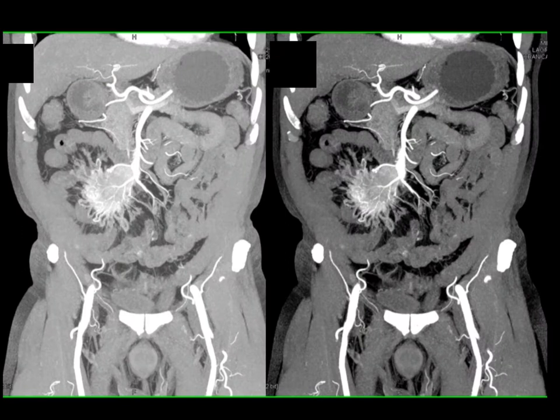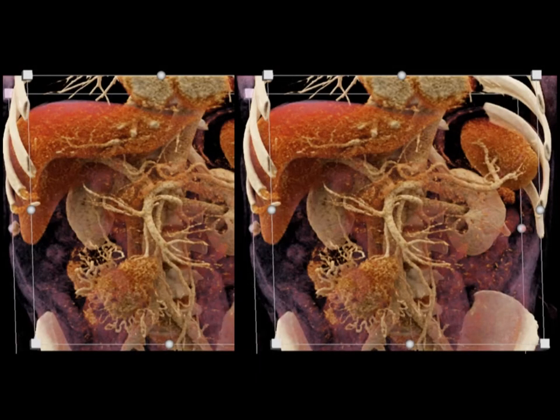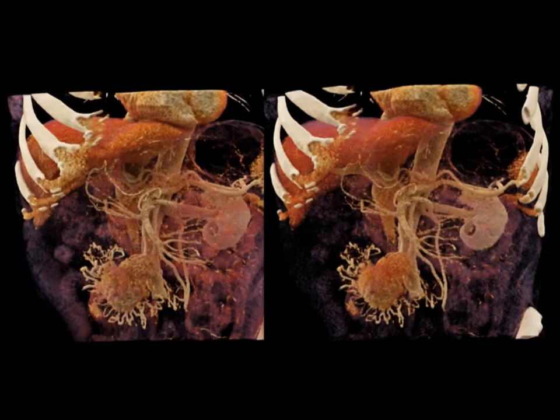Again, these patients can develop intestinal ischemia. You can see that desmoplastic reaction is so extensive in this case with vascular involvement and diffuse infiltration. And if I show it to you as cinematic again, look at the beautiful, almost like a radial crown around the patient's tumor, that desmoplastic reaction, just a very classic thing. You can see desmoplastic reactions, I know, in sclerosing mesenteritis, but it's typically not going to be that extensive and not that much involvement. And here's just another set of images.